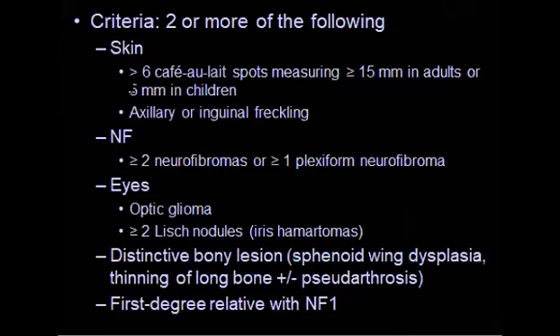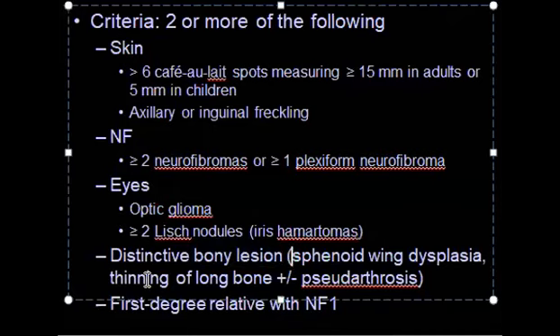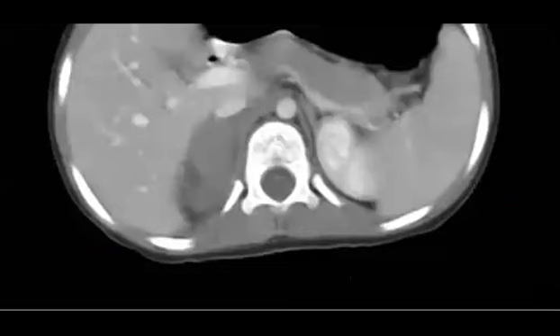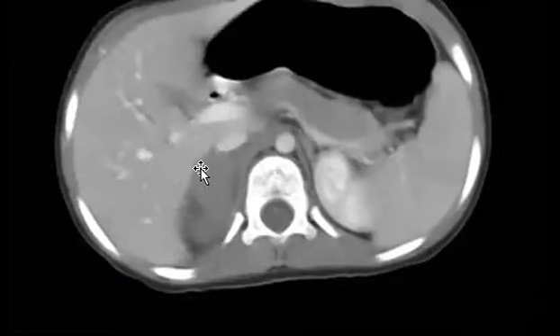The criteria in the skin: neurofibromas, plexiform, eyes, we remember it well. And some bony lesions can be in the sphenoid or long bones. Yeah. Okay, bowing, pseudoarthrosis, Shayma. Nice. Again and again, adrenal lesion in a pediatric patient. What is your differential?